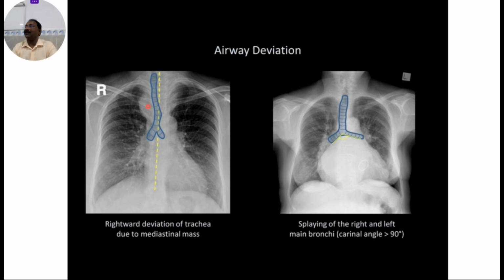Anterior mediastinal mass. So you are supposed to see that. See it in all the X-rays. So this is the mediastinal mass here. And concentrate on the carina. So this is the normal one. But see here, it is widened. Okay, see the heart. Is it heart or something else? So again a mass. Good. So this is a very important point.